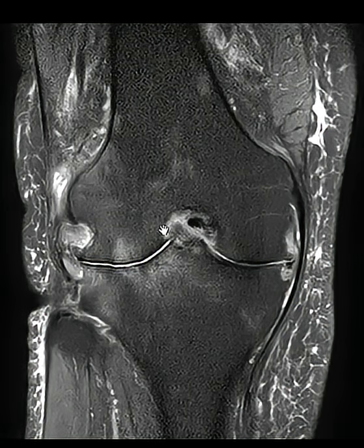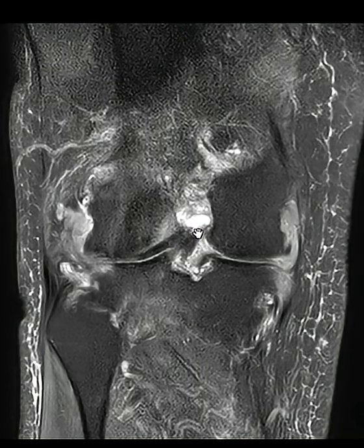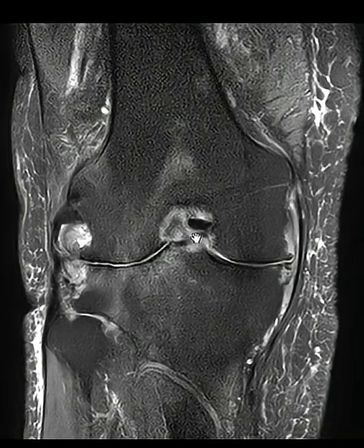So this is a case of an advanced synovial inflammatory process, probably gout, although psoriatic arthritis could do that.